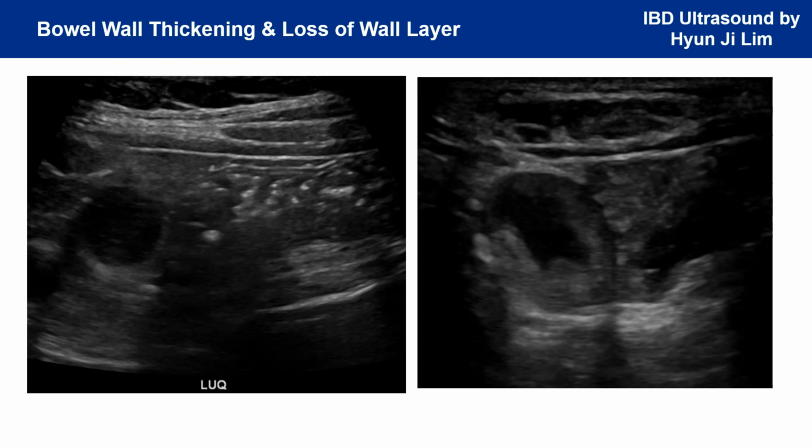Let's look at some actual cases. In the image on the left, the jejunum shows a normal anterior wall, but a thickened posterior wall. In the anterior wall, you can distinguish a typical black-white-black pattern indicating a preserved bowel wall stratification. However, in the posterior wall, the wall layers can no longer be clearly differentiated. The thickened bowel appears hypoechoic, showing a darker echogenicity on ultrasound.